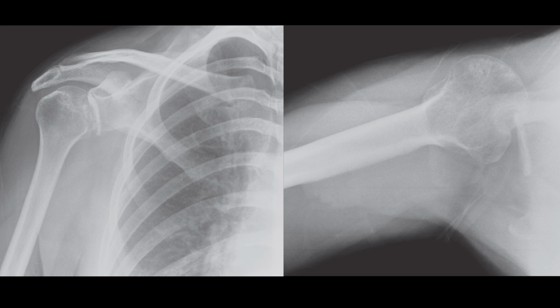The shoulder is the most commonly dislocated joint in the body, and understanding the features of each direction of dislocation is critical. While anterior dislocation is the most common, posterior dislocation, as seen in this case though less frequent, is significant and can often be missed in initial imaging.